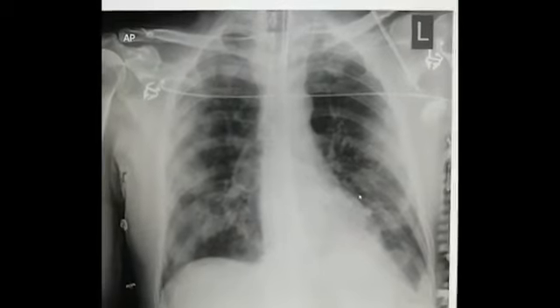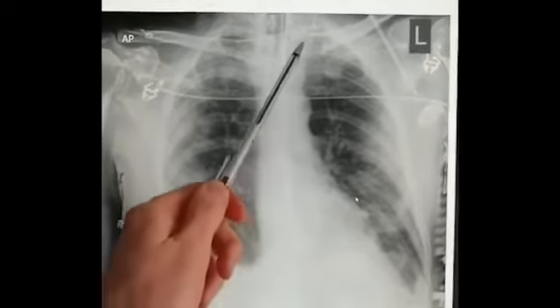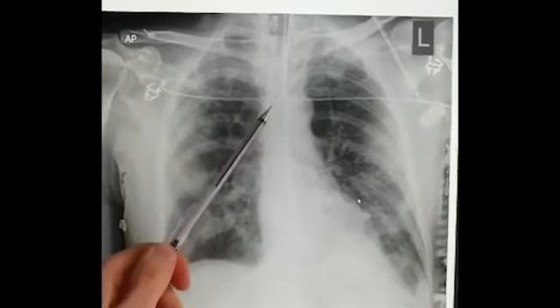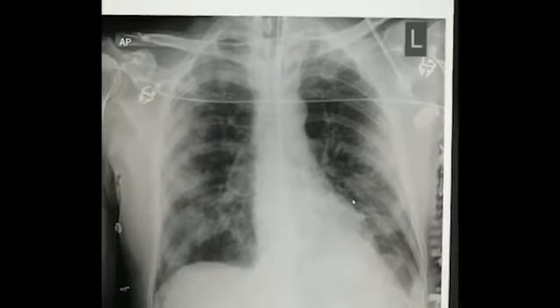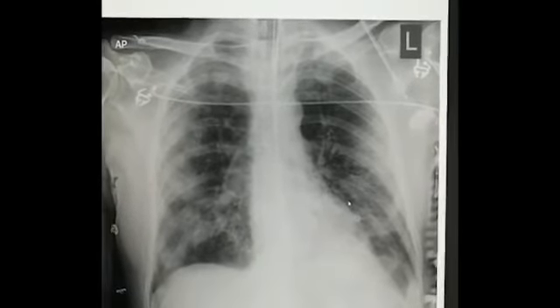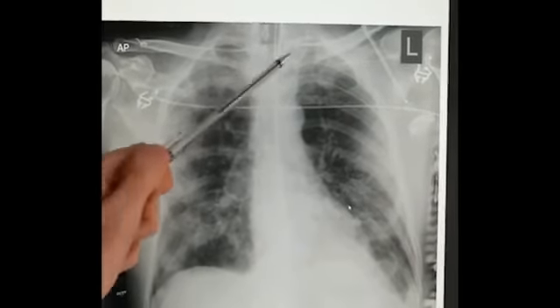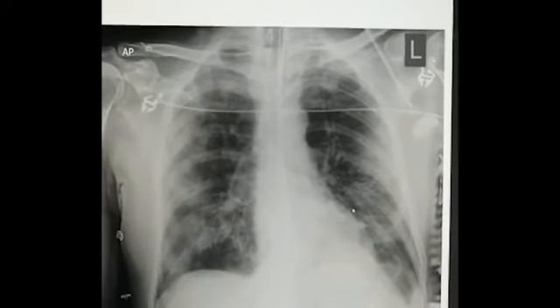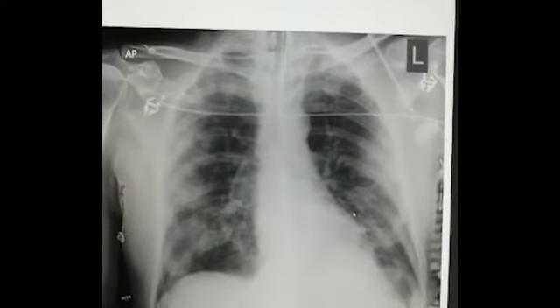A lot of these patients have central lines. Central lines may be in the right or left jugular. Here we've got a left jugular CVC line, just heading into the SVC there. And a lot of the x-rays will be to check ET tube positions. ET tubes can be difficult to find, but we've got an ET tube here, just projecting below the clavicles. Sometimes we're putting subclavian lines in, and these are more visible under the clavicles.